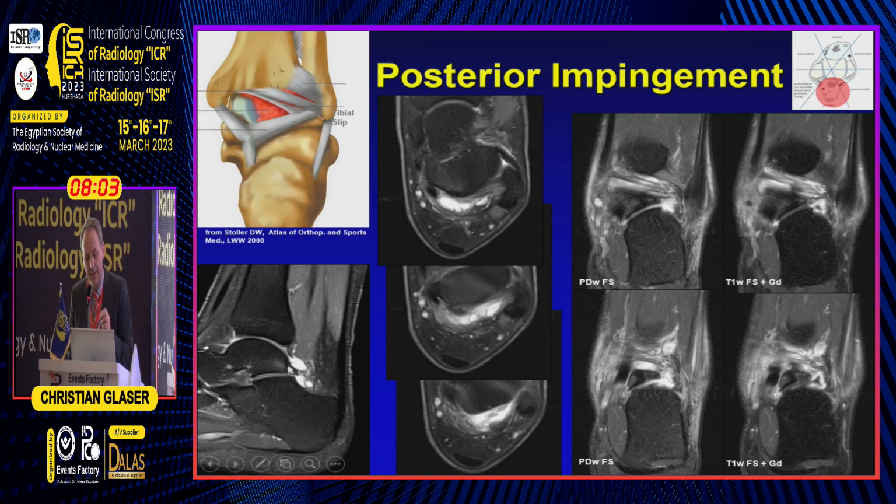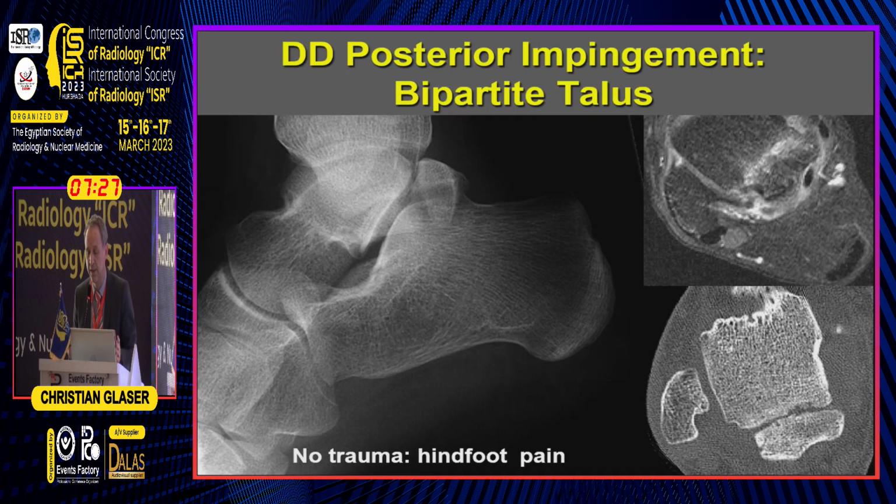And there is an interesting finding, a bone marrow edema pattern around the synchondrosis, which is indicative of a certain mechanical disturbance. There is a disbalanced mechanical load, and that's our interpretation. It is not pain, we can't visualize pain, but it increases your confidence in the appropriate setting that the synchondrosis may be involved in that process. However, the surgeons would always try a conservative approach to give the patient a chance to first treat the inflammatory reaction, and if it appeases, all the better.